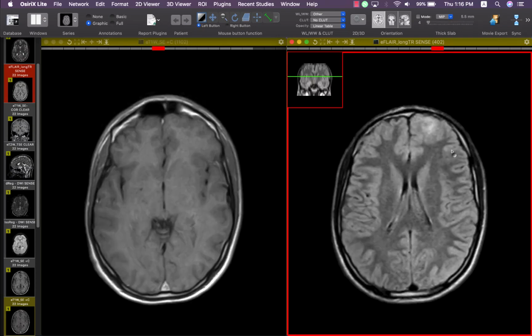If we need further investigation to make sure that the lesion is a focal cortical dysplasia rather than glioma, or to differentiate between both entities, we can do MR spectroscopy, searching for the choline peak. In glioma, the choline peak is usually elevated, while in focal cortical dysplasia there is no elevation of the choline peak.